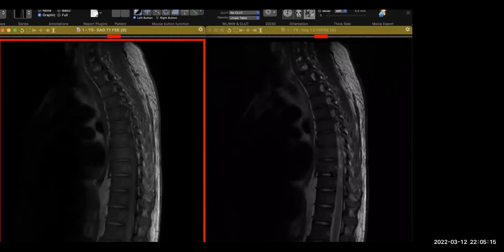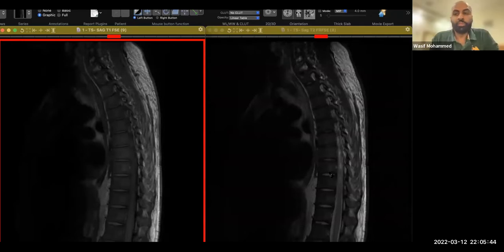So in such a case, there are a couple of differentials which fit into this. It could be, in a male patient, a prostatic malignancy with diffuse sclerotic metastasis. We would have to include the possibilities of multiple myeloma or other pathologies which involve the marrow, such as mastocytosis. We would go through the PACS folder to see if this is a diagnosed case. There's no previous imaging or clinical history for this patient. Any other differential?